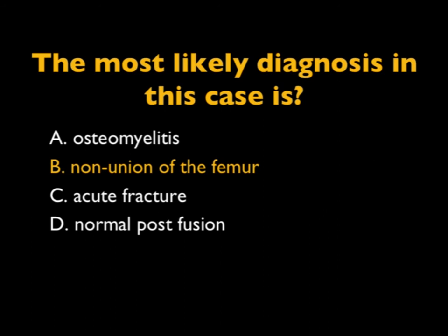This is also a nice example of Paget's disease. Paget's patients can have increased incidence of sarcoma. There is no evidence of sarcoma in this case.